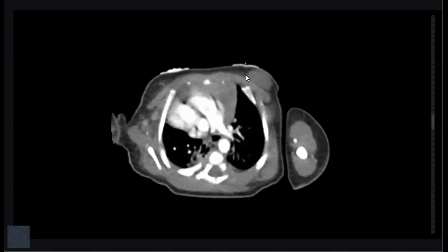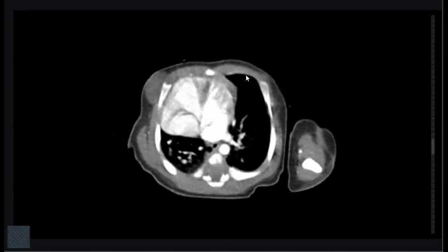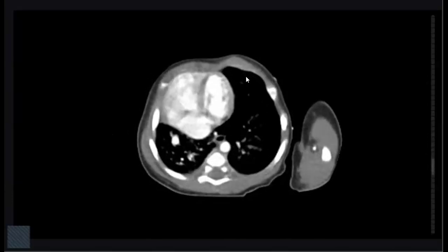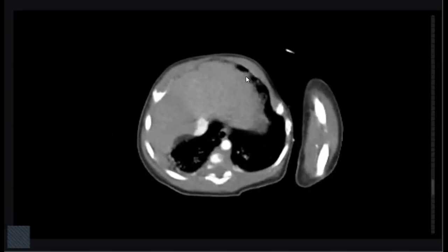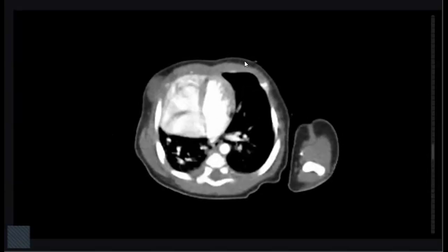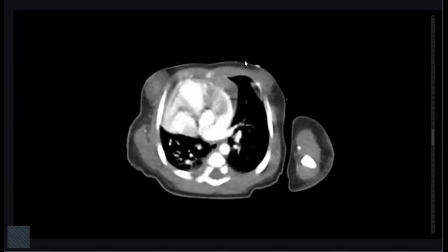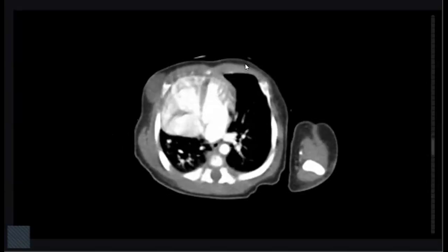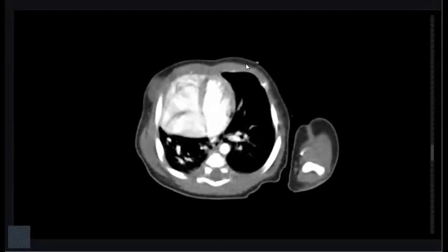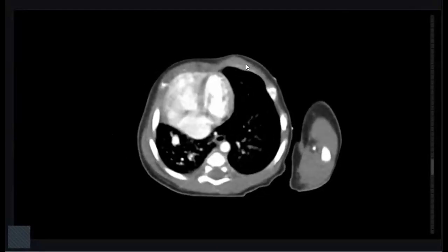This is a CT scan of the chest with contrast. Here I can see there is a mediastinal shift toward the right side. Yes, I can see the lung window. Give me the abnormalities. I think the abnormality lies in the left lung.